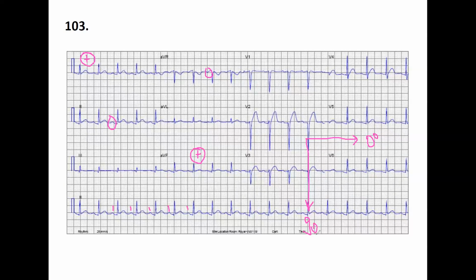Okay. And then if we look at lead number 2, one thing that you can judge it best, choose a lead that the perpendicular of the lead falls in this area. There are two leads that fall in this area.